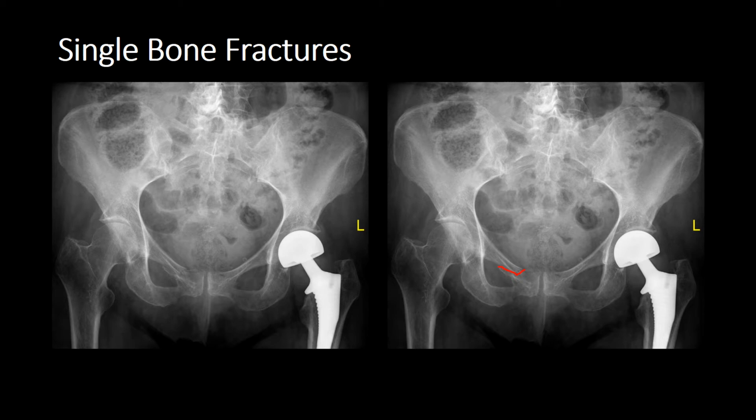Now, a neck of femur fracture can also be associated with groin pain, and a neck of femur fracture is more common than a pubic rami fracture, and so therefore they clinically get misdiagnosed as being query neck of femur fracture. So it's important that in all patients where you're examining for a neck of femur fracture you make sure you scrutinise your pubic and ischial rami very carefully.